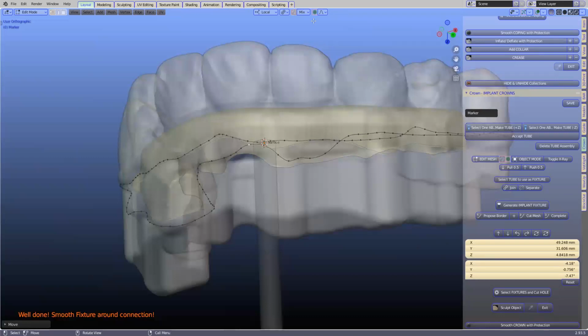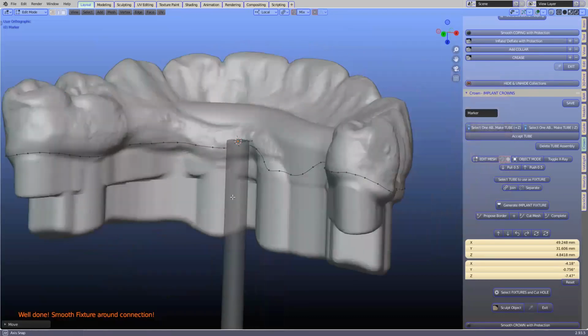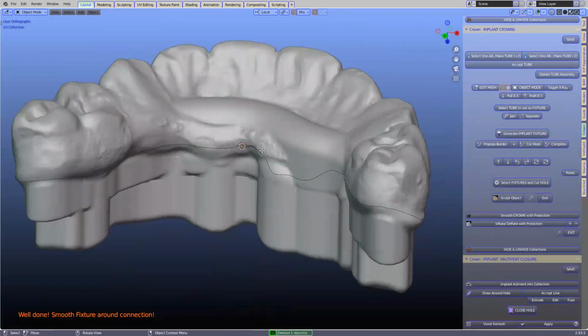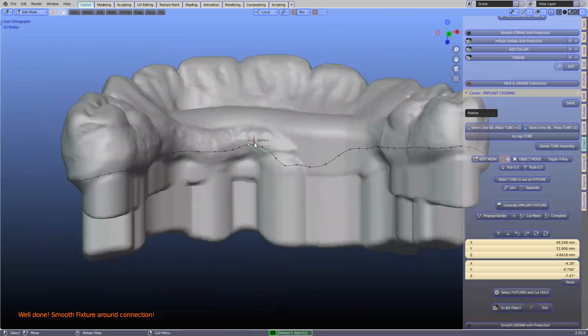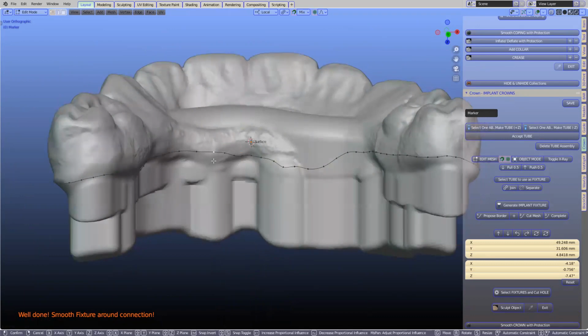Well, I think you guys know where we're heading with this. There's one that has generated while we were doing this earlier. So let's just get rid of the magnet, and bring this down a bit and see how that does the trick. Okay, that's looking a little bit better. Let's just cut the mesh again.